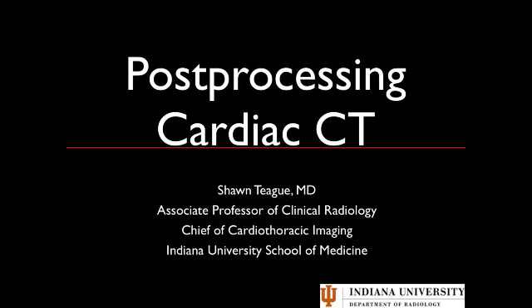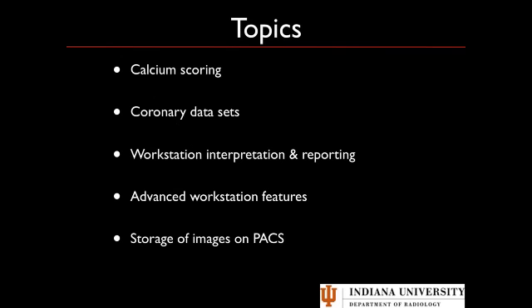Hello, we're going to talk about post-processing related to cardiac CT. So here's our topic list.